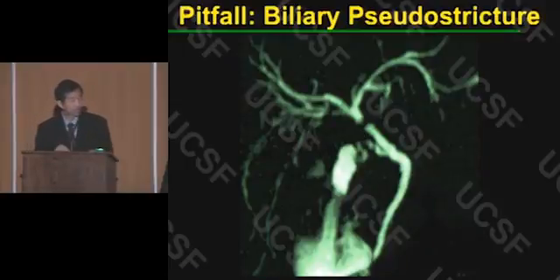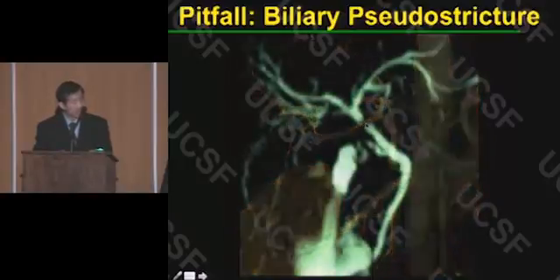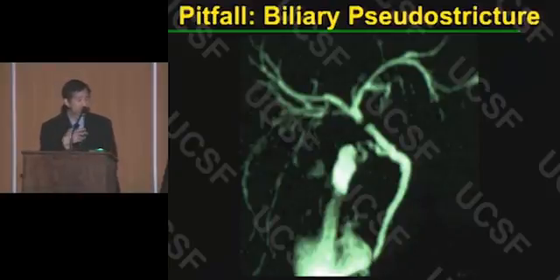What do you think about this? Well, this is a biliary pseudostricture. There's a common reason for the stenosis. It's the right hepatic artery that crosses the bile duct right at that location. And at imaging, there's often a band-like impression, very narrow in diameter, that occurs here or may occur a little bit up higher, sometimes a little bit down lower, maybe diagonal. But if you see just a band-like area without upstream duct dilatation, don't worry about it. Don't report it on your MRCP or CT report. It's just a normal variant, not worthwhile mentioning.